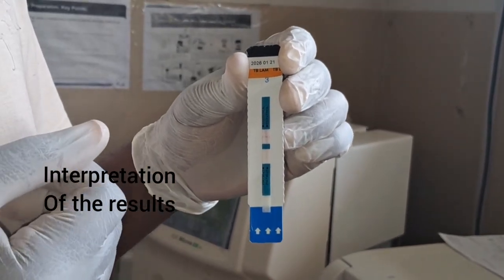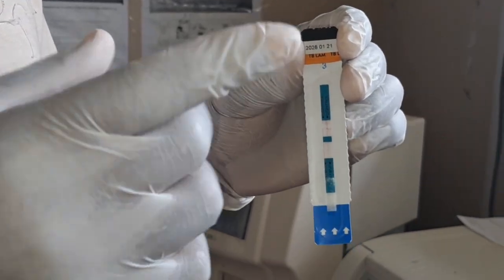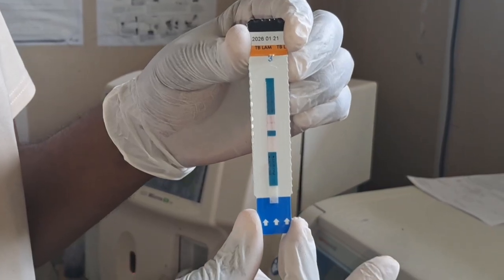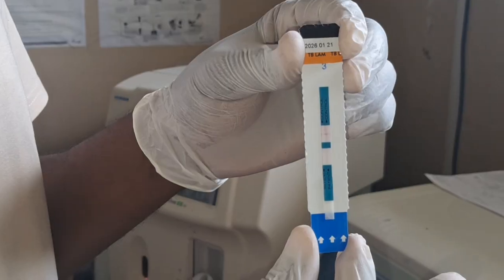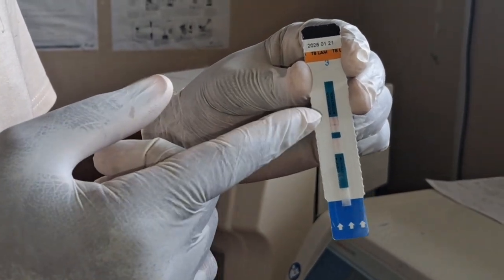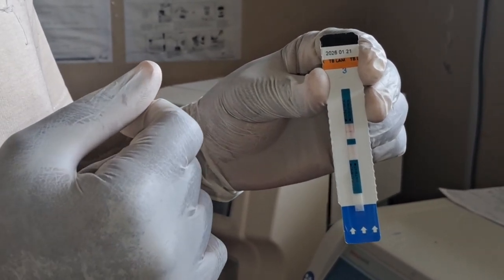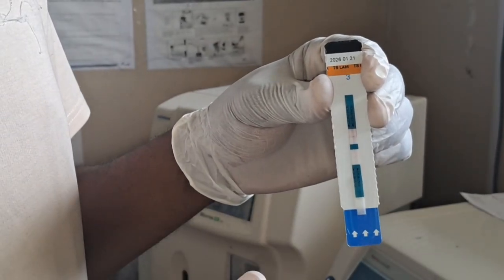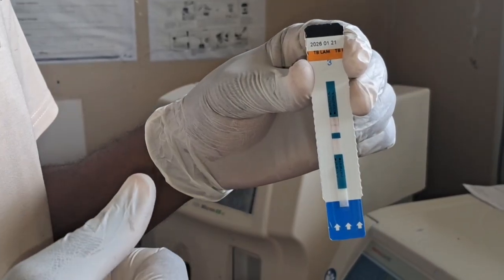Interpretations: this control line validates the test kit. It shows that the test kit is okay to use and the procedure went as planned. If this control line was not found here, that would show that the kit or the test is invalid. There may be something wrong with the kit or the procedure itself.